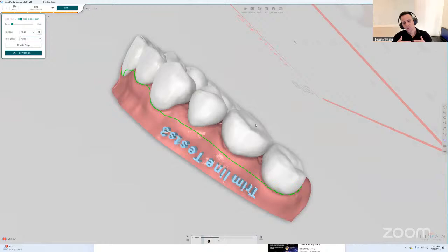But a few versions ago, we added the baking of that trim line so that when it gets exported, you can have something in the model that says where the technician has to cut. So to do that, you come here and instead of point list, you select baked. When you select baked and you export the STLs, it will open something like this.